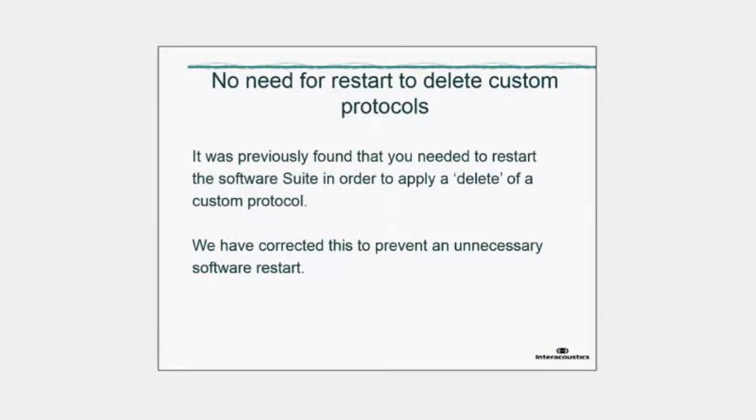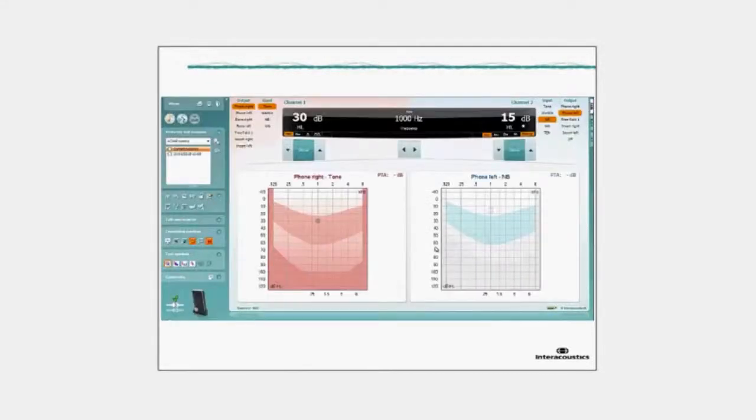Another common feature is that we've removed the need to restart in order to delete custom protocols. So it was found in the previous suite that in order to remove a protocol that you'd manually created, you had to restart the software. So on the next slide, I've got a nice video to show you how this is applying this now. And if I just press play.